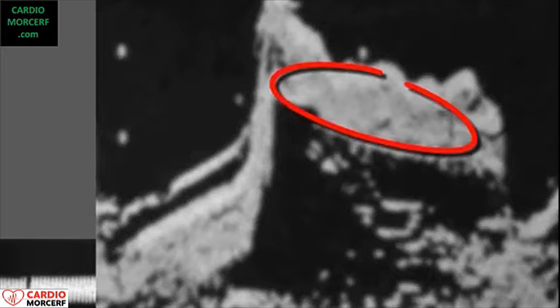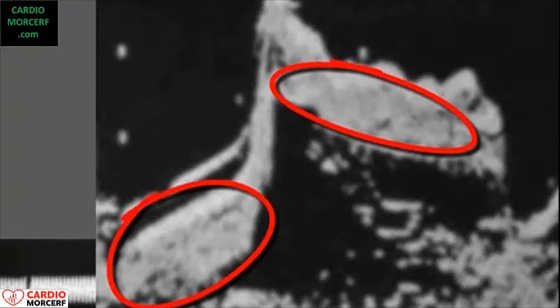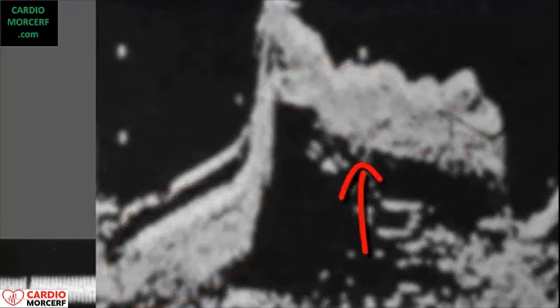Look at this aspect, like a cotton or a cloud. You see no lines. Look at the torn paper border. This is a classical aspect on M mode. This aspect doesn't happen in a calcified or just thickened valve with no vegetation, unless there are also vegetations.